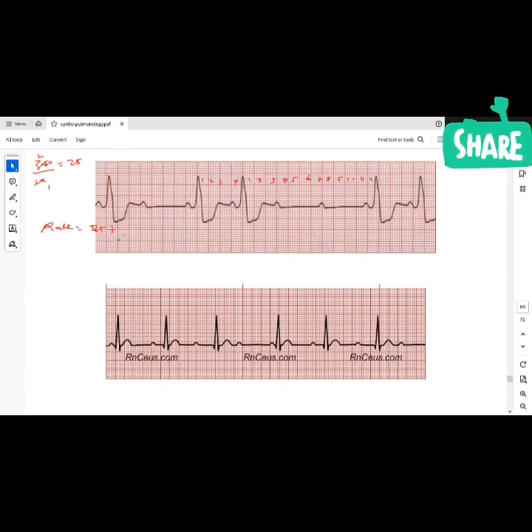About 31. So what is the interpretation of that? Oh, that's bradycardia. And that is approximately 31, so it's bradycardic. All right. So what do I do next?